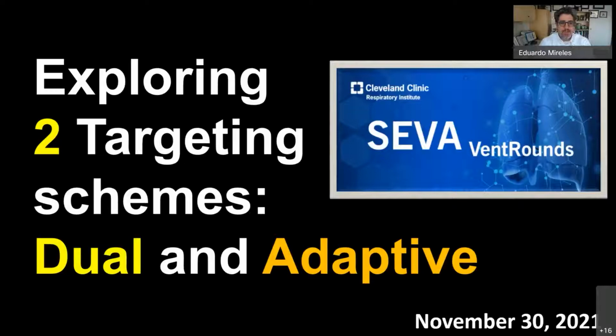All right. Good afternoon, everybody, to SEVA VentRounds. Today, we're going to be exploring two targeting schemes, dual and adaptive. These are images from our own ICU, and they're pretty fresh in general terms. So we're going to get started.